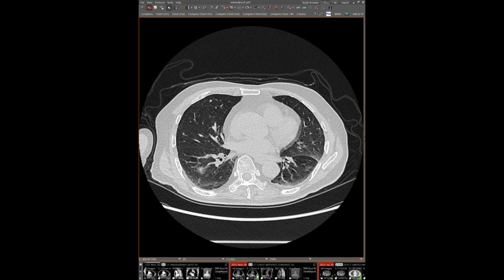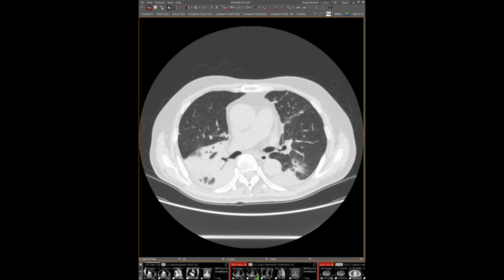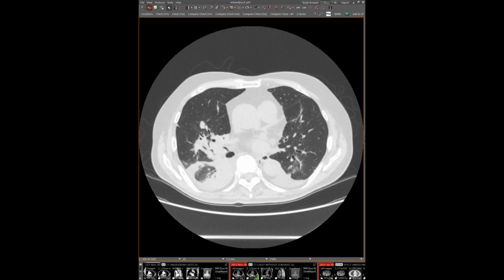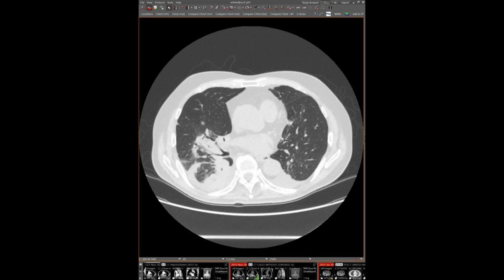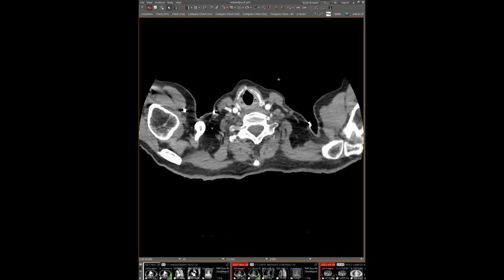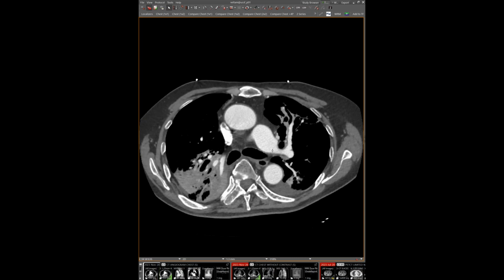Because it looked like that right upper lobe is now in the wrong location, and there's a large amount of consolidation in that right upper lobe, which is now in the lower part of the chest, we raise suspicion for possible infarct, right? When torsion like this happens, you can get either usually venous, but also sometimes arterial infarct. So we did a CTA the same day. And this is that study.